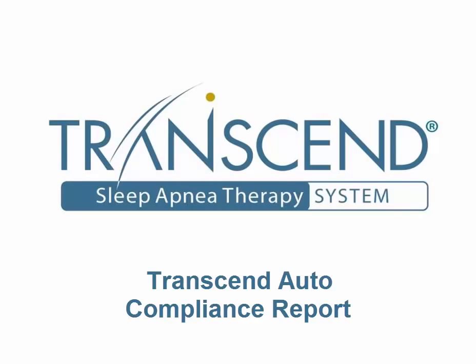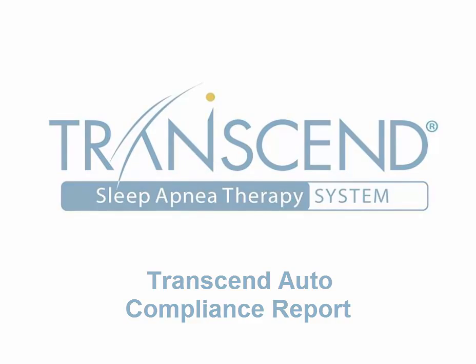The compliance report displays several sleep parameters used to define efficacy of therapy. In this video we will cover each parameter of the compliance report.